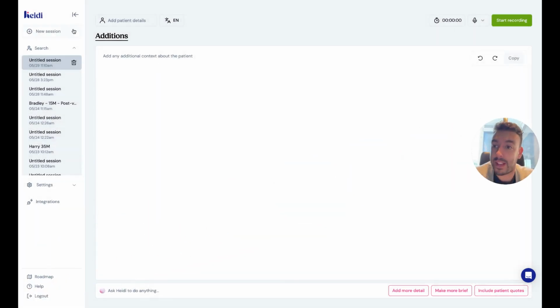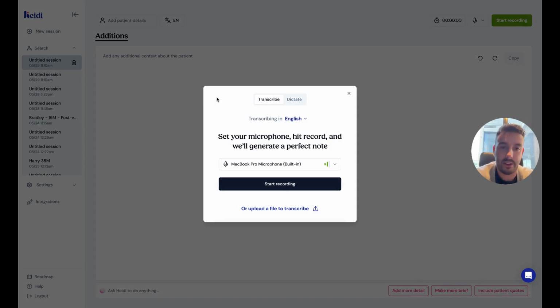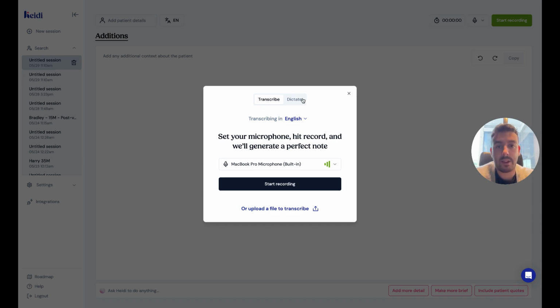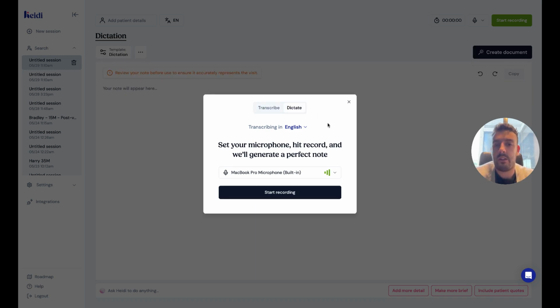So I'm just going to move my face over here and create a new session. So same as always, you can transcribe in lots of different languages. You got your microphone and upload and start recording. Something new here is that you can dictate. So rather than having to record a session, create your note, write it out, then click dictation, you can now dictate an entire session using this mode.